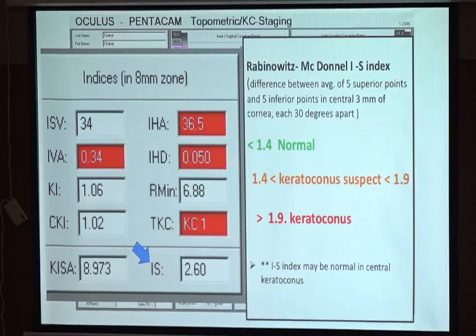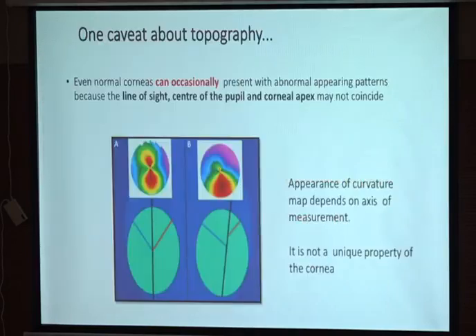But again here important to remember, some patients may have central keratoconus. The cone is very central. There, in the earlier stages of the disease, you would not have that asymmetry. Right? So K readings of more than 47.2 and inferior superior asymmetry of more than 1.4 should have us looking for the other red flags.